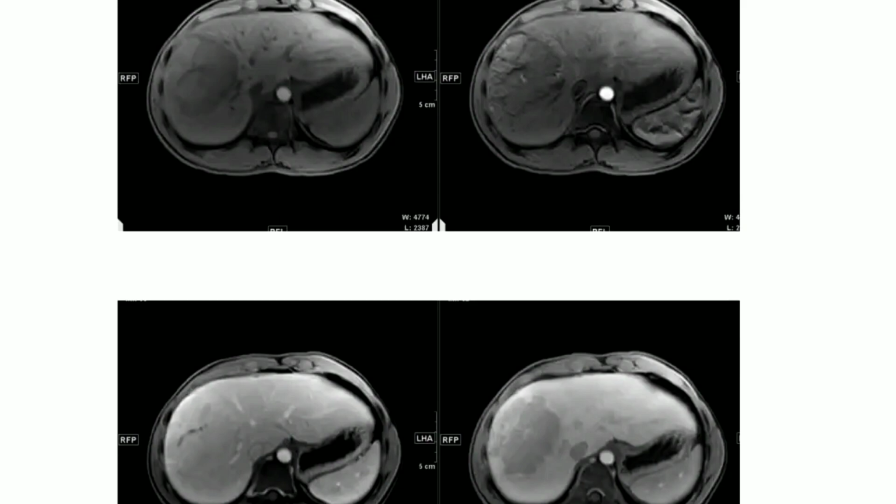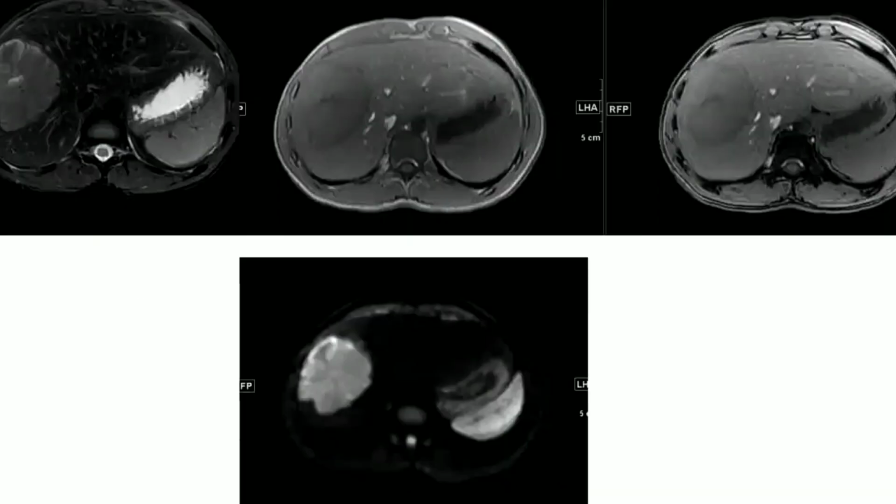Okay. So as we mentioned, we have many signs. We have the scar, as we said, fibrolamellar. Now the main question for differentiating is: is it FNH, a benign lesion, or is it fibrolamellar HCC? We said FNH, the scar is enhanced in the delayed phase. Yes, agree. How about the other features? Would FNH show heterogeneous T2 signal intensity? Would FNH show significant diffusion restriction similar to spleen?